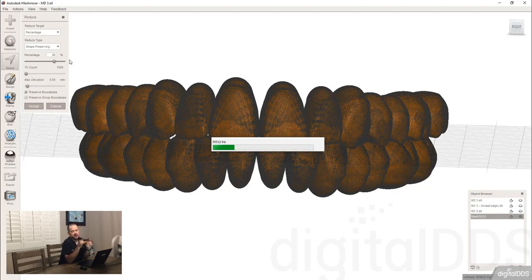But with this particular tool, like tools like Hollow and Make Solid, you can change the settings and it won't update till you click an update button. But with ones like this, I kind of wish that they also had an update button where you could mess around with your settings and then hit update, because every time you change a setting, it starts to update.